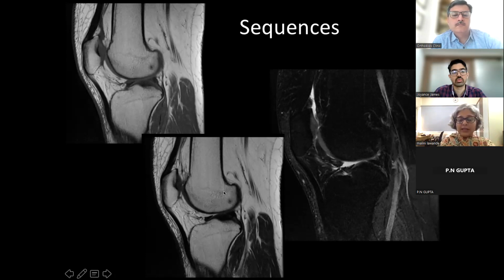But when I look at a T2 weighted image, the marrow is already fatty, which is bright, and most of the pathologies will have some amount of edema or increased fluid content. So the majority of them look more bright on T2. Bright marrow, bright lesion, I can't differentiate between them. So I need to find a T2 weighted image where fluid remains bright, but I need to make the fat dark.